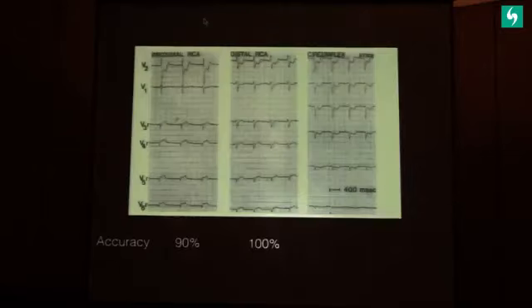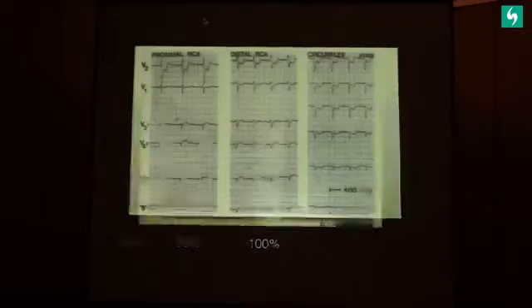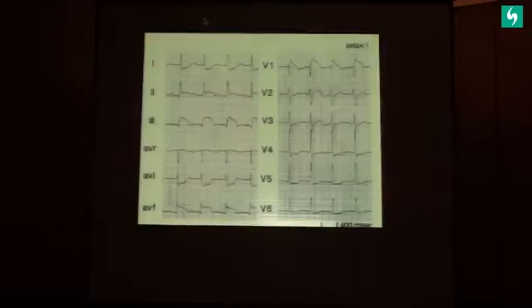Okay, you can get down to telling proximal, mid, distal coronary artery, circumflex, mid or proximal, but let's forget about that at the moment. Let's look at one more ECG. This shows you lead 1 is ST depression. So the vector is moving away from lead 1, cannot be circumflex artery. Lead 3 is more than lead 2, so it has to be right coronary artery.